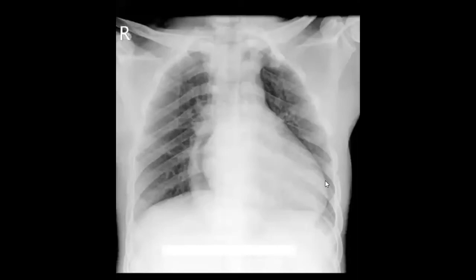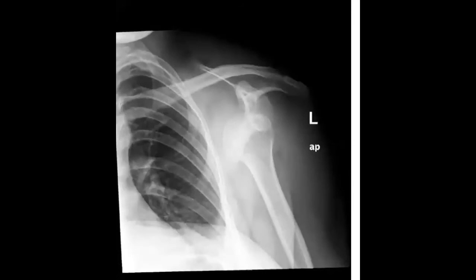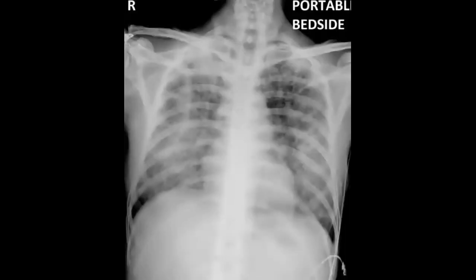Yes. So this one is again a rapid reporting case. It is an easy one. You check the acromioclavicular, and if you go to check the glenohumeral articulation, you will find that there is a dislocation. Yes, anterior dislocation of the left shoulder.